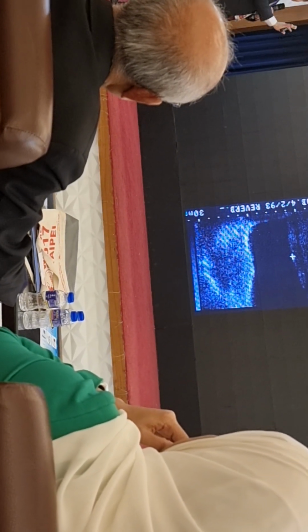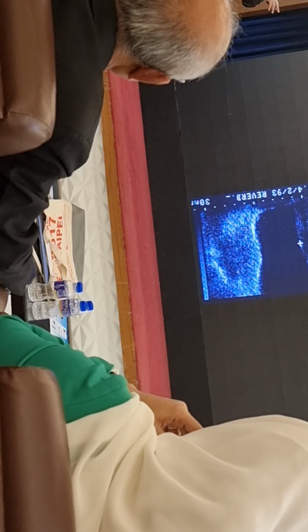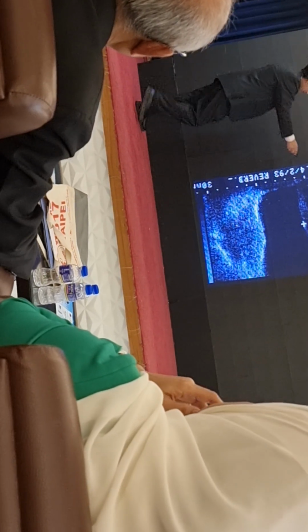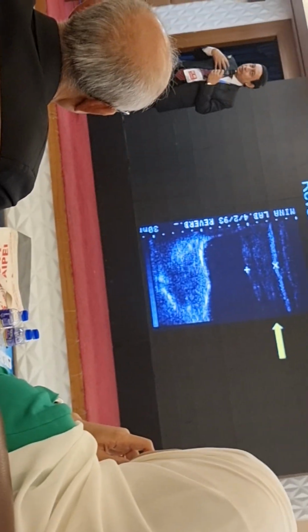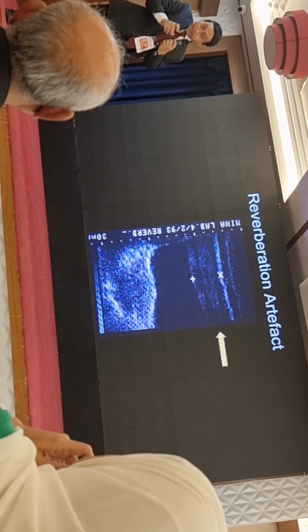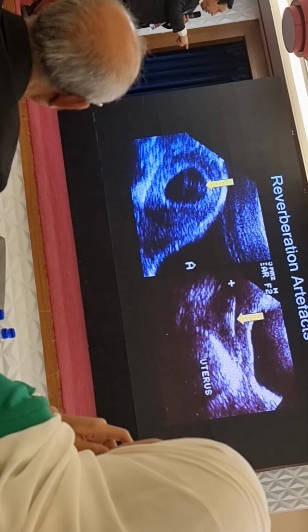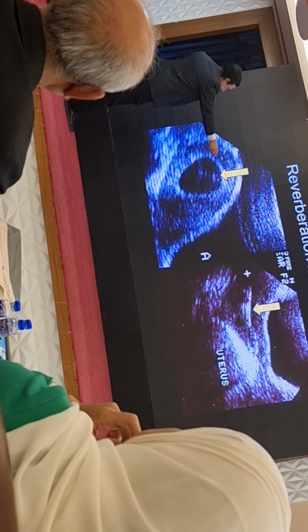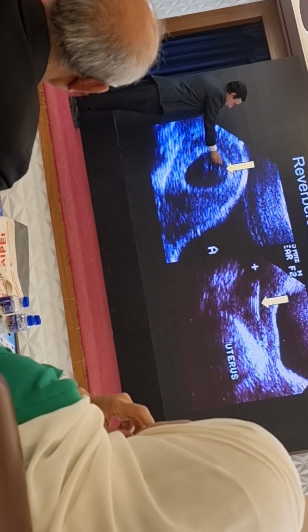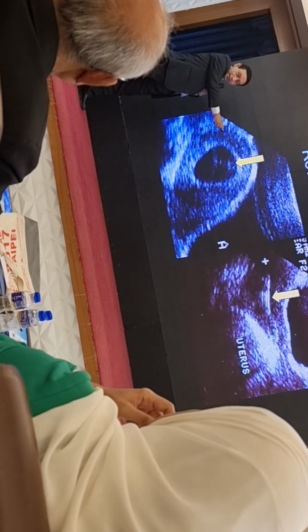And here this is very common, the reverberation artifact. Each and every patient will get this reverberation artifact. All of us know this is reverberation artifact. But in some situations, this is uncommon. Inside the gestational sac, you will see this one. This is also reverberation artifact.